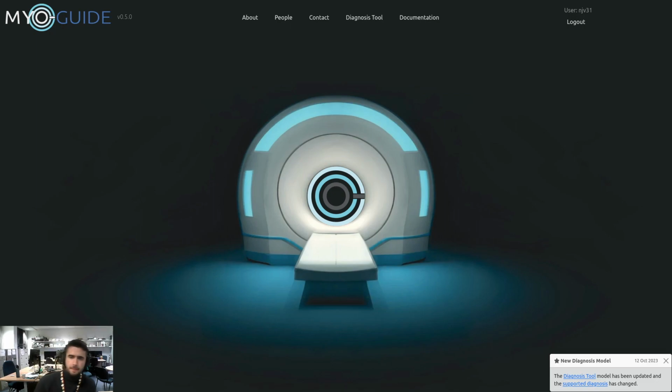In this video, I will give you an introduction to the web platform and how to use the different applications we offer. The cover page is the entry point for the platform. It offers the essential information about the project as well as links to the rest of the content and tools.